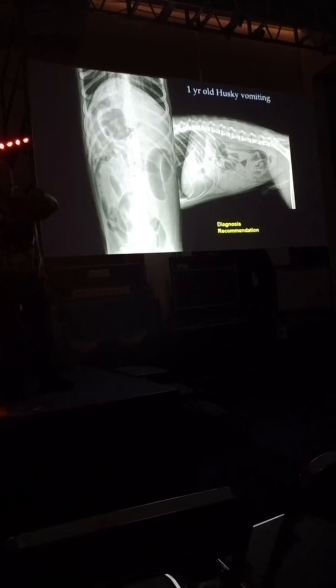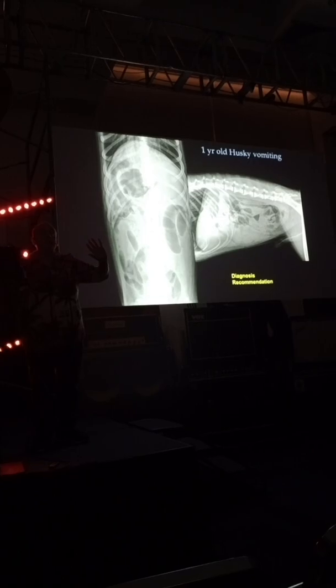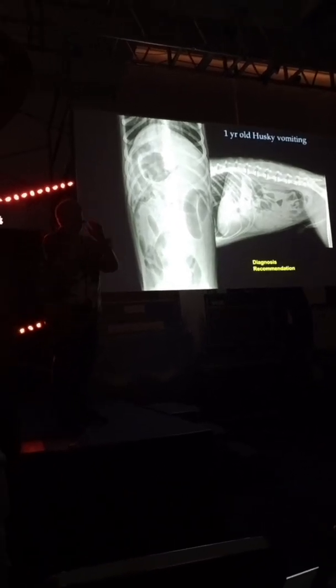Normal. Some people say normal. Who said it was normal? I'm going to ask. If you said it was normal, that's not a problem, because we're going to learn from it. Let's say you thought it was normal because you weren't sure.